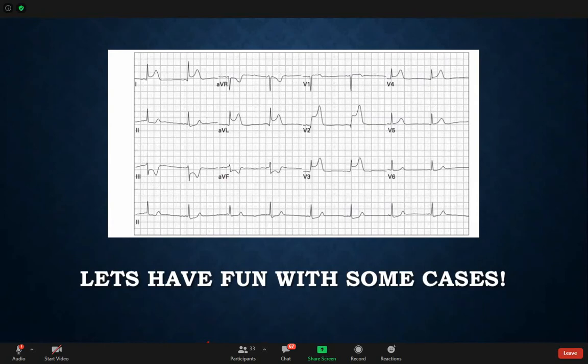Okay. What's the next step after that? The T wave, the ST segment. ST segment. Okay. At V2 and V3 and AVL and AVF and AVR. But first, let me explain.